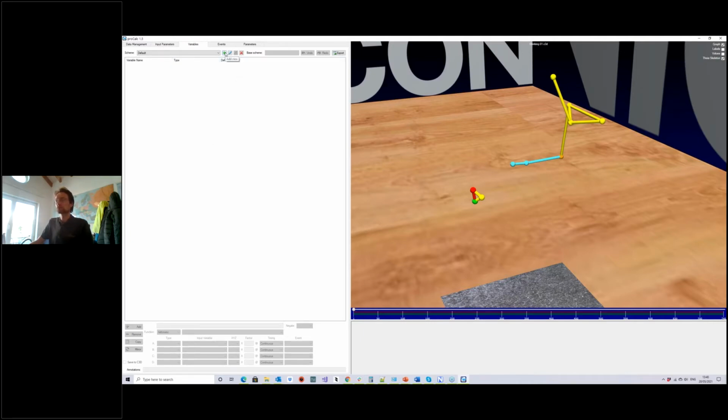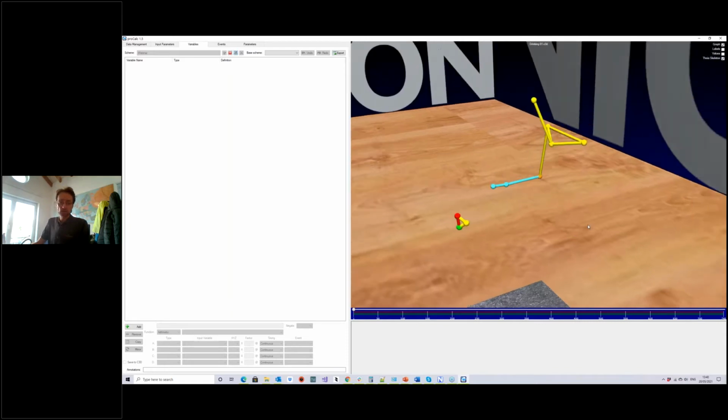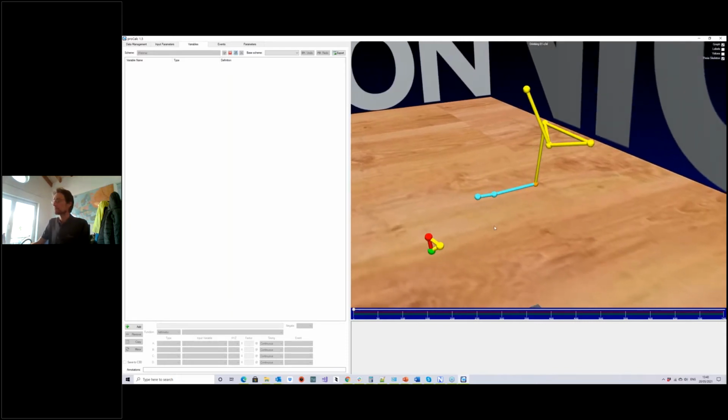What I shall do today is start a brand new calculation scheme, and I'm going to call it webinar. And I'm going to start adding variables. It's very important, obviously, to plan what you're aiming to calculate.